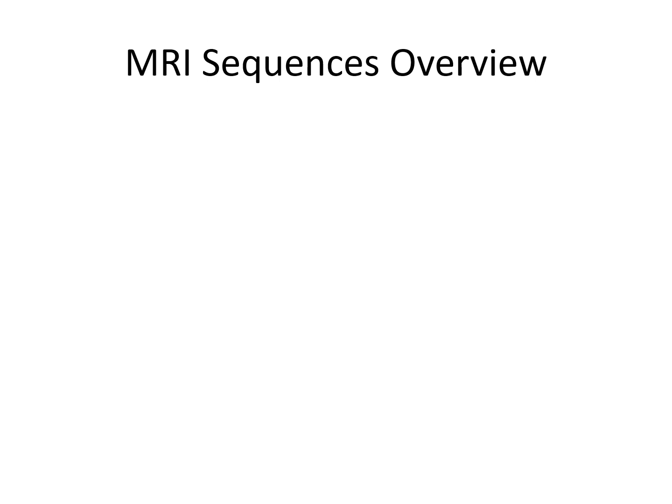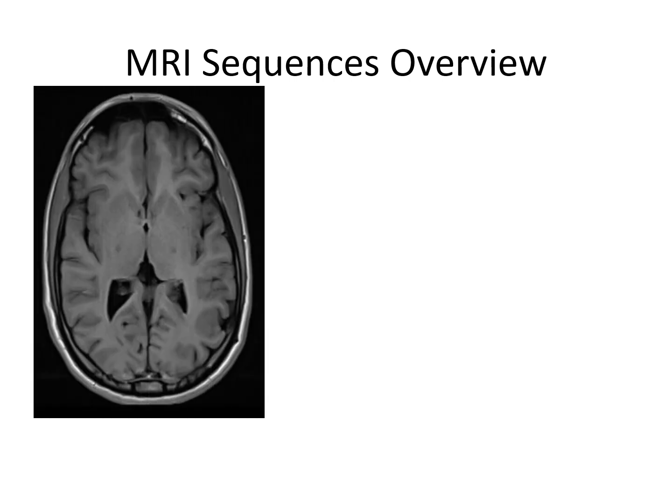In this video, we will cover MRI anatomy of the brain in a simple, systematic and high-yield way. So let's begin with the MRI sequences for brain imaging. First one is the T1 weighted image.